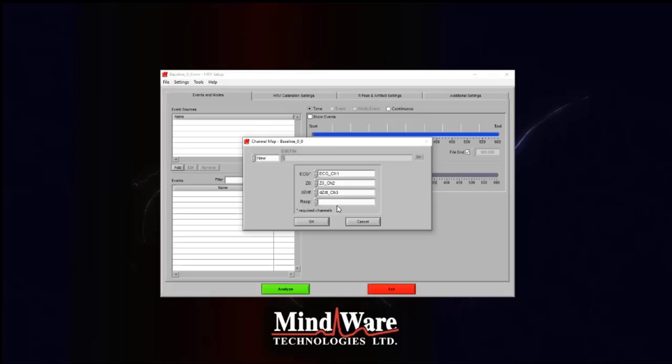So if we can easily apply a respiration belt, or if we happen to also be collecting the sympathetic side of things, such as impedance, we just get this bonus of deriving the respiration from there. So by mapping it in this way, obviously we'll want our ECG, but if we also map these impedance channels, the application will know to derive the respiration from those. If we did have a respiration belt, the traditional approach, we could unmap these, make them white, and then we would turn on our respiration channel. And I'll show you exactly when we do map it in this sense.